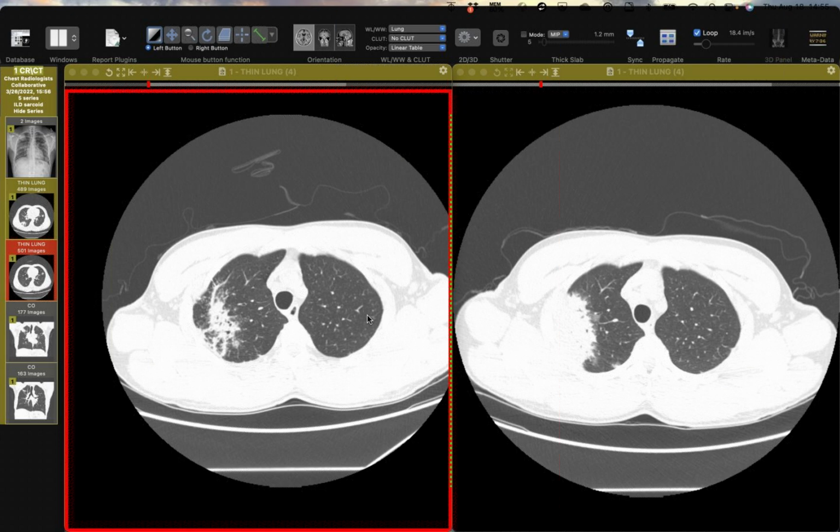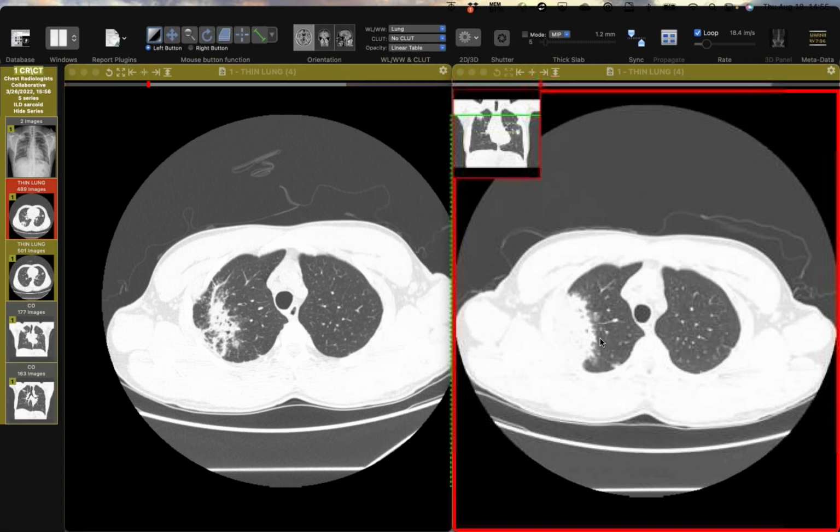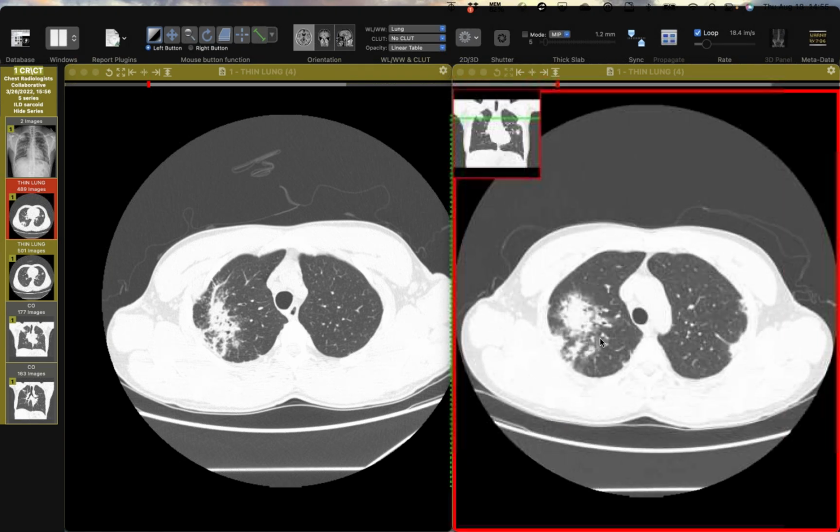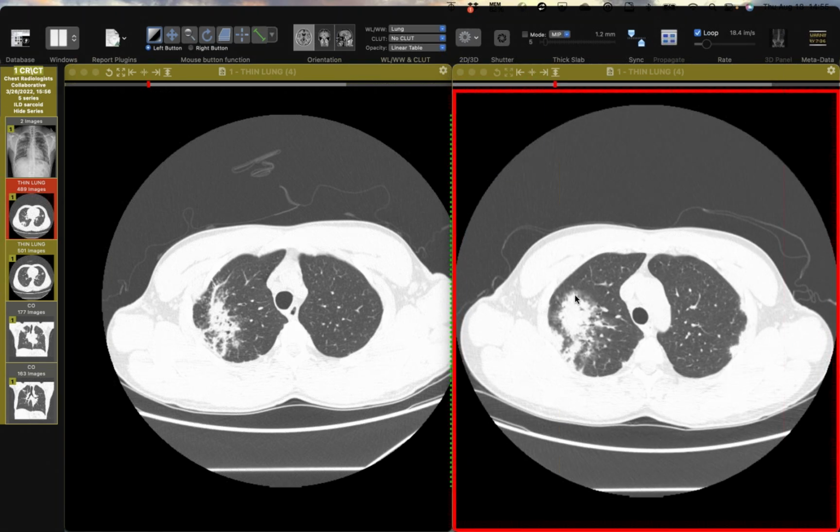And hyalinization. And people didn't think about EGPA or anything like that. Yeah, vasculitis would be a good thought for the initial scan as well. Yeah. Those shaggy margins are what really throw me off, because I've seen cases of sarcoid with mass-like consolidation, but you can usually pick up nodules along the periphery that tip you off. But yeah, this one is just interesting.